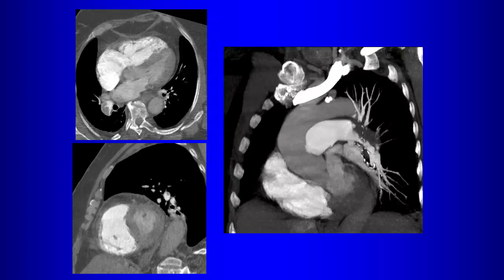How well can I evaluate the pulmonary arteries? What do I think, all right? I mean, those are numbers that they will use for studies because they have to have some kind of objective measurement of what's going to be an acceptable scan to include in their study, what's going to be suboptimal in terms of technique in the study.